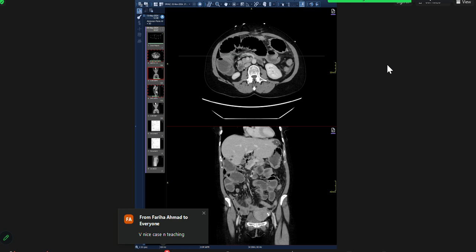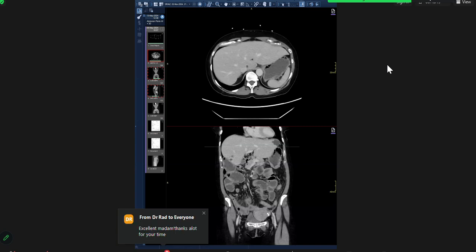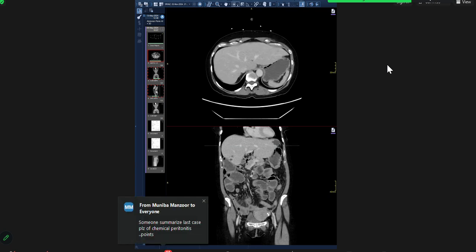So I'll have candidate 3, I think. What is in the liver? Okay, liver. Yeah. So this liver, I'm just going to tell you in a minute what it is. One minute. Okay, so the liver is a combination of cysts and hemangioma.